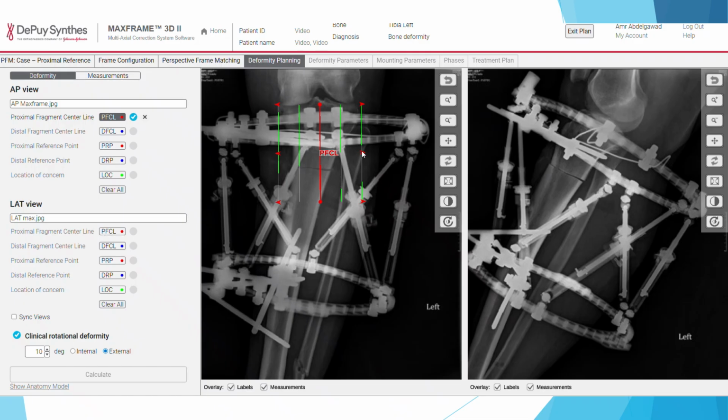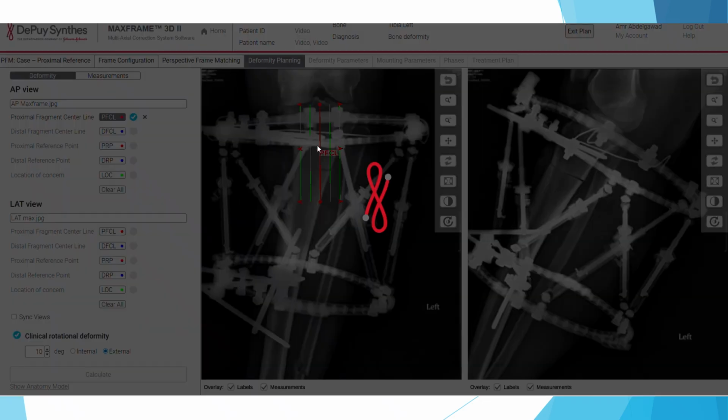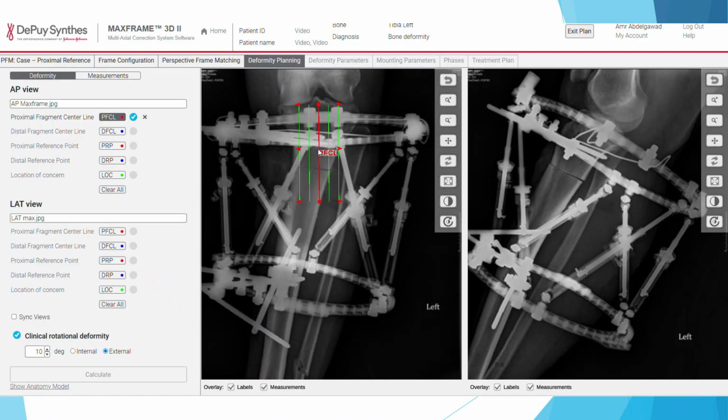in most cases you can consider perpendicular to the joint. It's 88 degrees, but for simplicity it's here, and this will help you in the diaphyseal part, as we're going to see. You can expand it, you can do this, and then you can always move the line, because that's the central line.